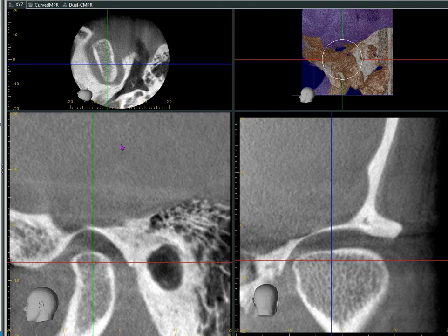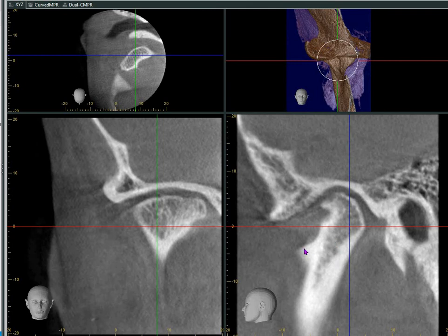Now, let's take a look at a diseased jaw joint in a patient with multiple symptoms. In this joint, you can see quite a difference in the way the condyle and the joint areas look. It's almost as though a grenade went off in this joint. There's severe degeneration, sclerosis, and overall breakdown. This is the typical patient who suffers with severe migraines, headaches, jaw pain, tinnitus, and dizziness.